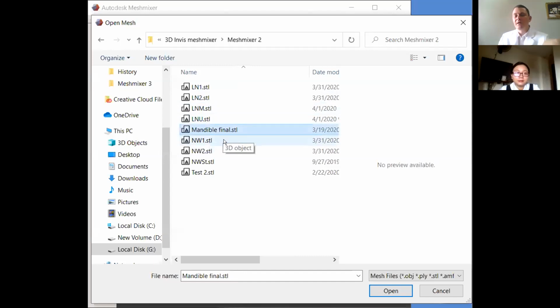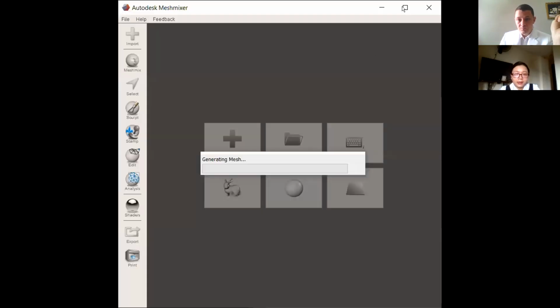So here it's the same file, but we did it with one slice in 2 and not 1 in 4.